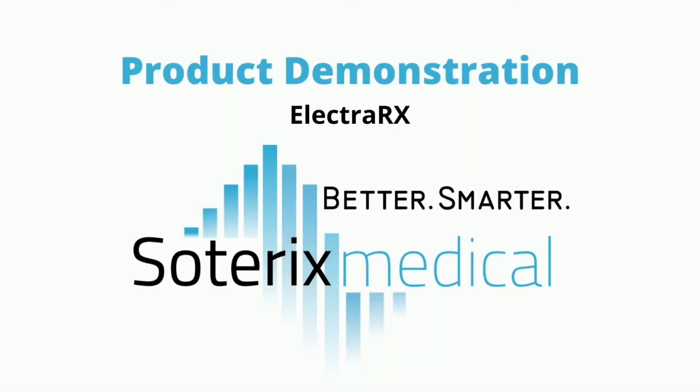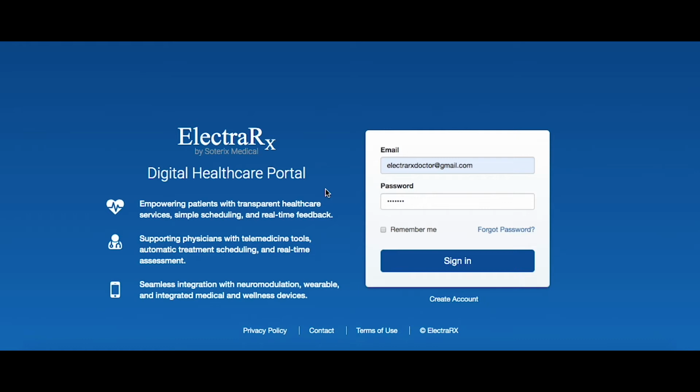This is an instructional video about ElectraRx, an online stimulation session management portal provided by Soterix Medical for remote neuromodulation. The portal is accessible at soterixmedical.com/ElectraRx/login. After purchasing the equipment, the Soterix Medical support team can help you set up your account.